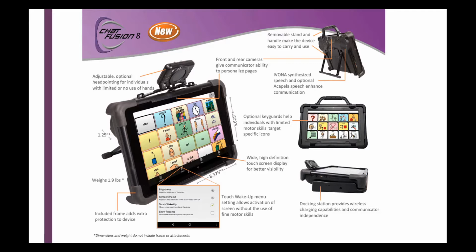A nice feature of the Chat Fusion line is the ability to touch the screen to wake up the device. Options available for access are the chat point for head point access, single and dual switch options, as well as the screen function as a switch. Keyguard options are also available.